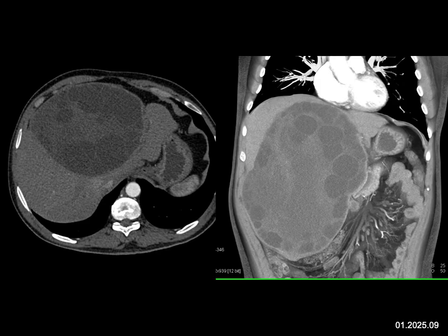Metastatic ovary to liver occurs, and the mets can be cystic. Remember, cystic mets, you think ovary, you think GIST tumors as two good examples. But again, the multiple daughter cysts bother me. It doesn't look like that with ovarian cancer or with GIST tumors. You often can have multiple lesions, sure, but not one big lesion with multiple internal daughter cysts. And so the best diagnosis and the right diagnosis is Hydatid disease.